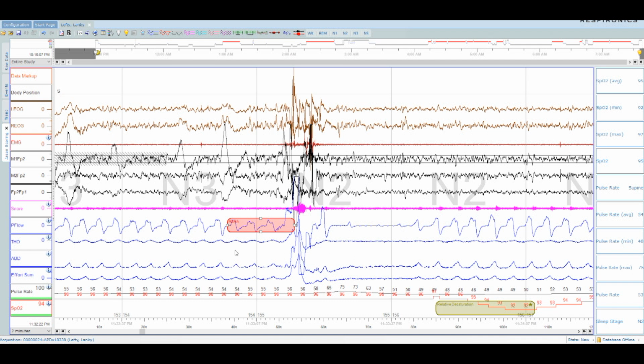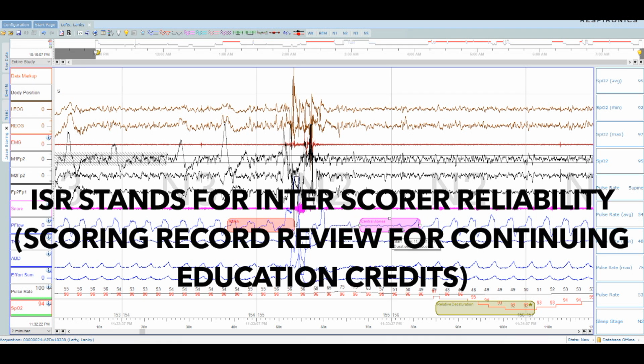Now in Oscar, when I'm doing Oscar data reviews with people, I always mention that obstructive central apneas are fake. Here we go. Look at this. See the belts, the abdominal belt here, the thoracic belt here, how they're moving? They're flat over here. Oh my God. Jocelyn, what's happening? Do people call this central apneas? They sure do. ISR even calls those.